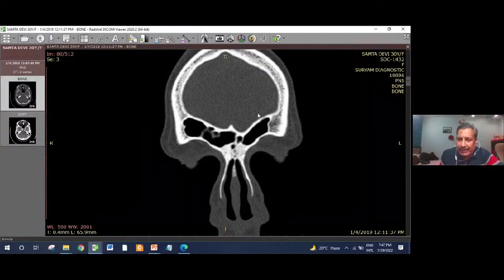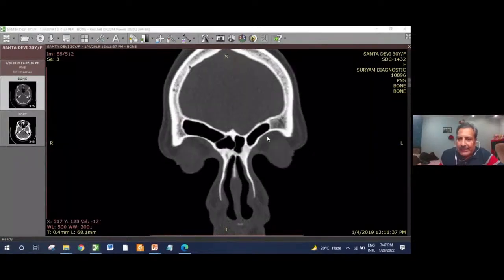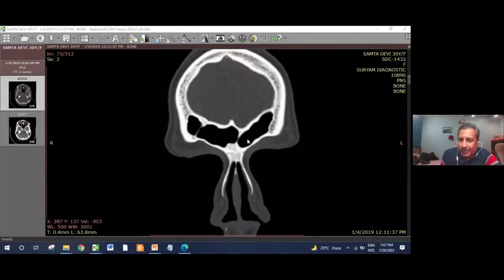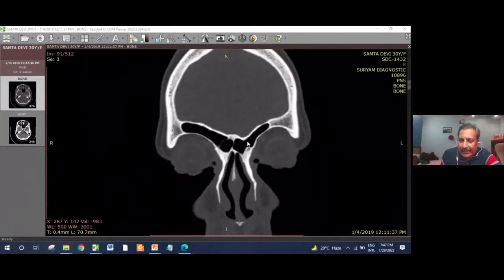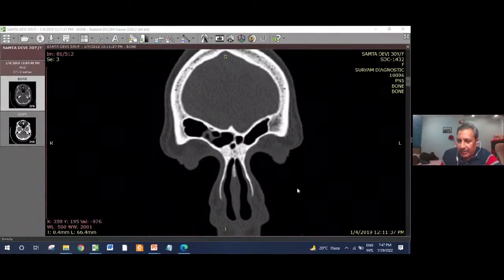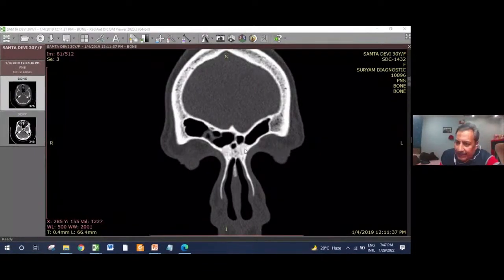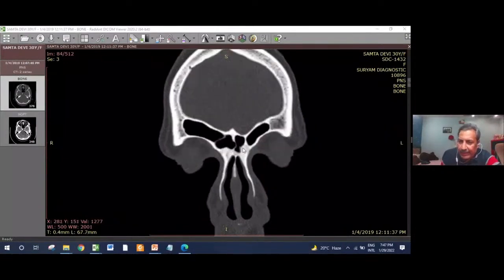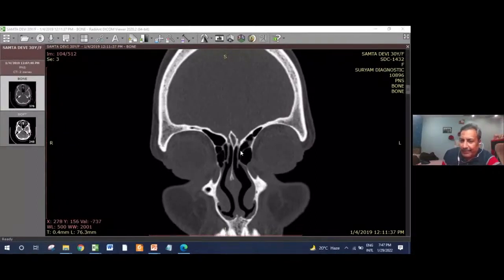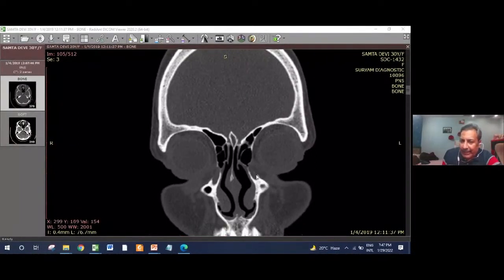Sometimes the frontal sinus is less pneumatized, and this cell is pneumatized bigger than the frontal sinus. See this? The frontal sinuses on both sides, supraorbital cell. Now, as long as the frontal sinuses are there, you don't see the maxillary sinus because you are too anterior. Now see, the supraorbital cell started coming. You can see the pneumatization of the maxillary sinus or the maxillary bone has come.